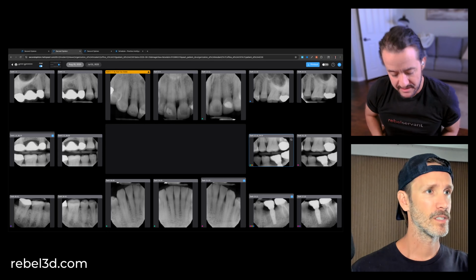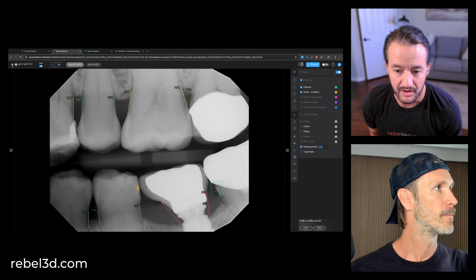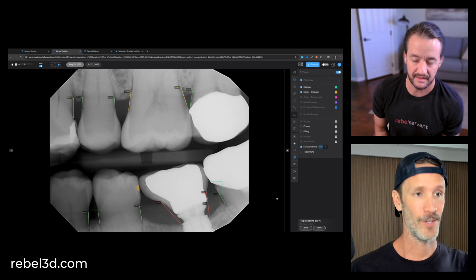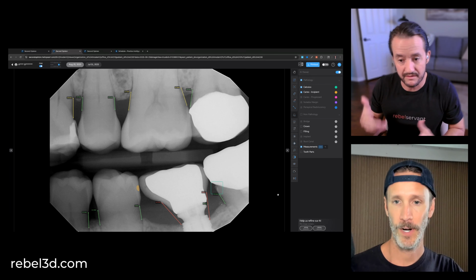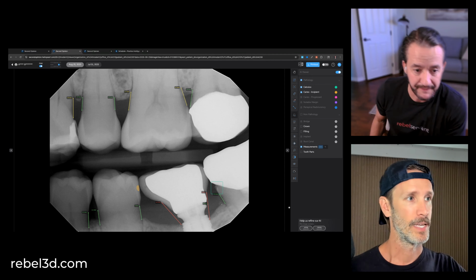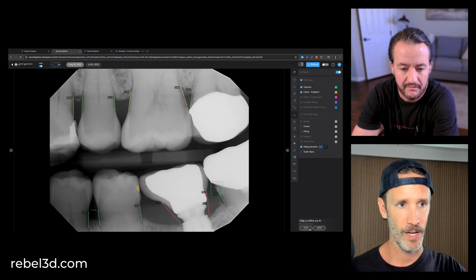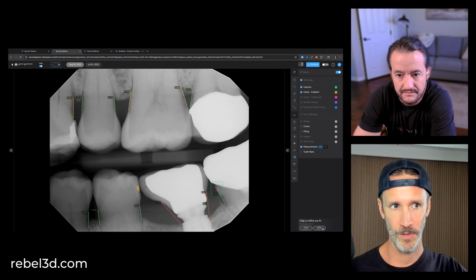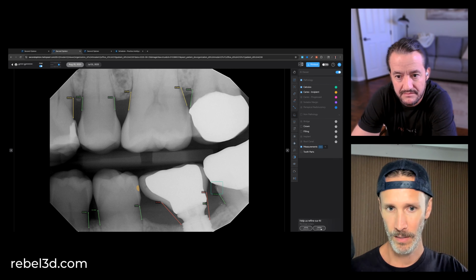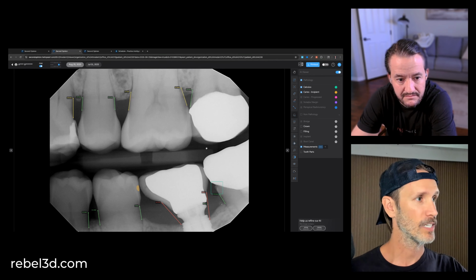So, I want to talk about that. If you see false positives, can you mark them or report them in a way that maybe trains the model better and keeps track of things? You can. There's this little thing on the bottom right that says help us refine our AI. You can tell if there's something that's wrong, which is a false positive, or if there's something that's missing. And then you can also go in and adjust things that are already in here too.